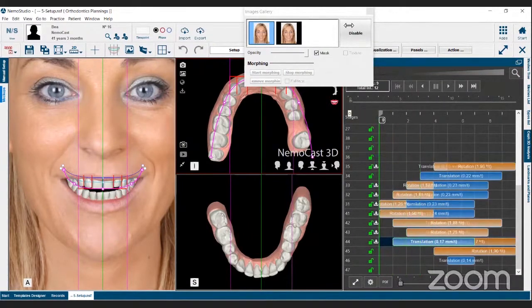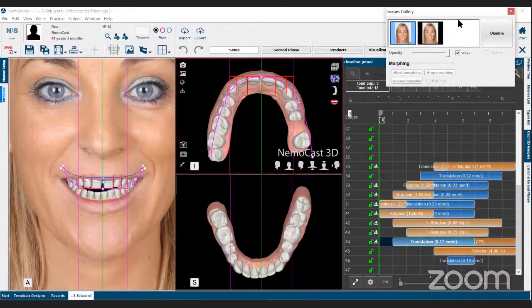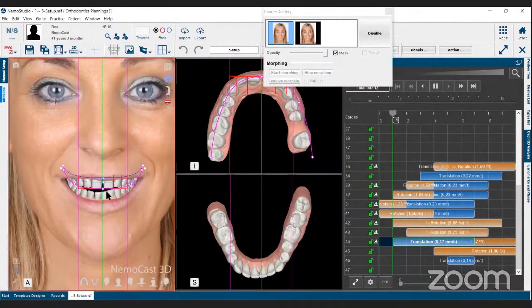we can see how the teeth move and if there's going to be any problem between them. You see, that is the initial movements. That is the initial relationship with the guidelines. And we can see how the teeth are fitting in according to the design, for which we used our guides to center our smile.